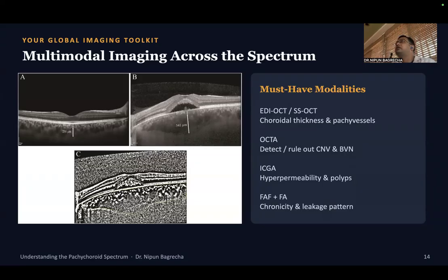One more differential diagnosis has to be kept in mind: hyperemic disc, multifocal CSR-like subretinal fluid accumulations. That is the VKH syndrome. When we do an OCT, there are multiple bilateral subretinal fluid accumulations. But the catch is that there will be fibrin septae in between. Why should we differentiate between them? Because in one case we should avoid steroids, while in VKH syndrome, the treatment is steroids. So we should keep in mind this differential diagnosis also.